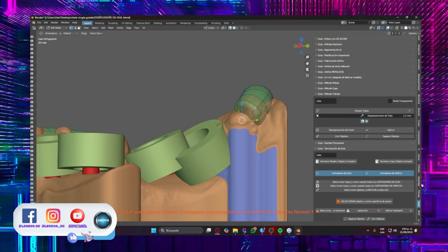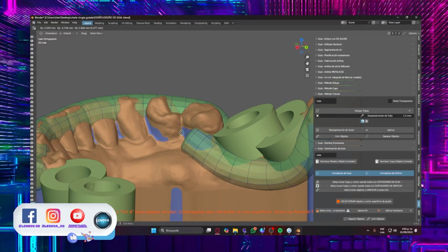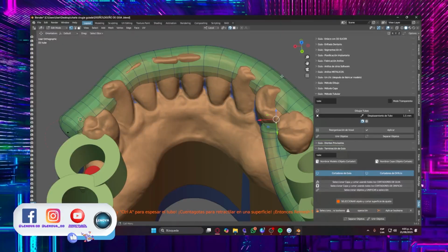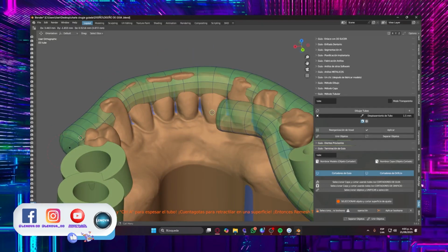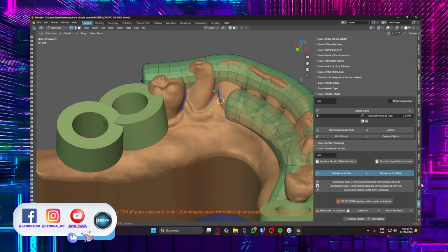Here I go for the torus. Now, if you noticed, on the buccal side, I send the line upper third or incisal third. On the lingual or palatal side, I will send the line that is at the middle level, right? Touching papillae. So it copies here and copies here on the line. And this is the strategy, and it is printed.